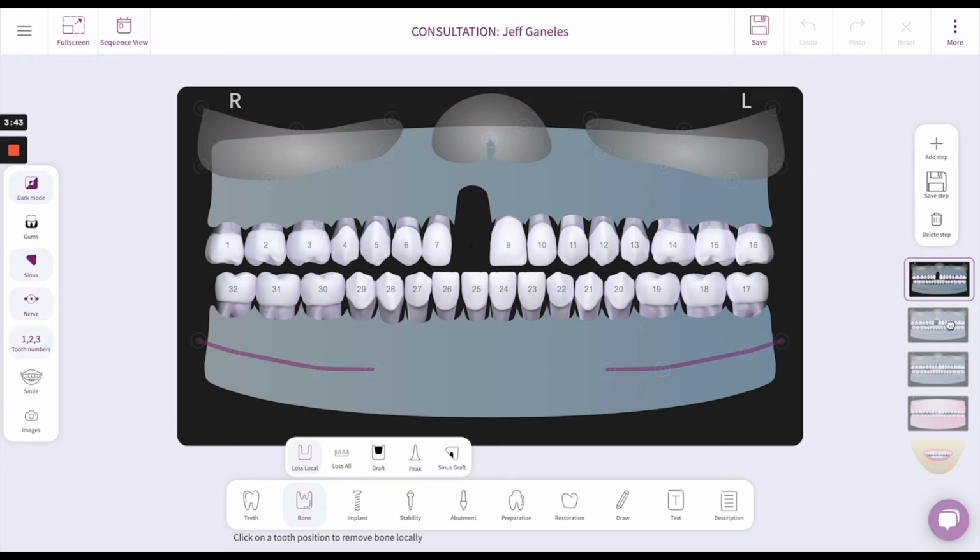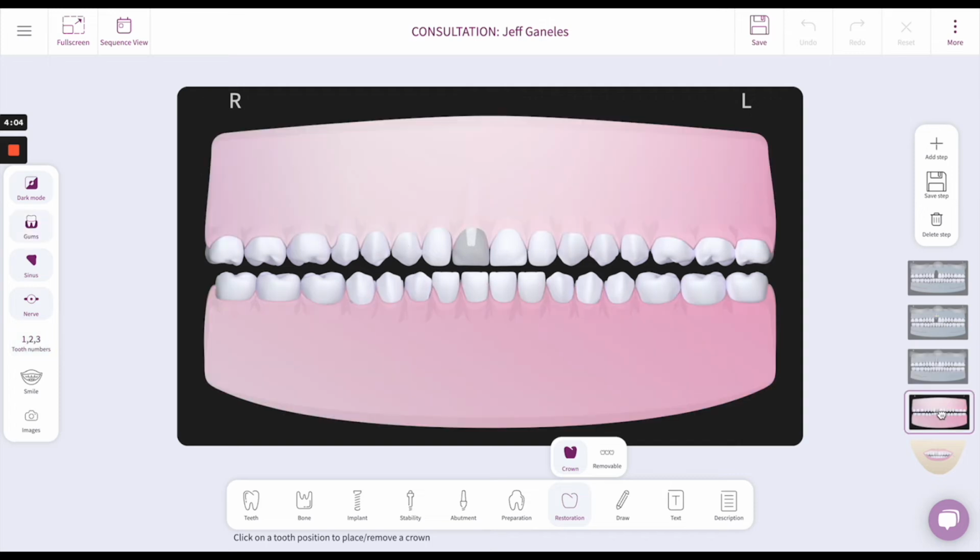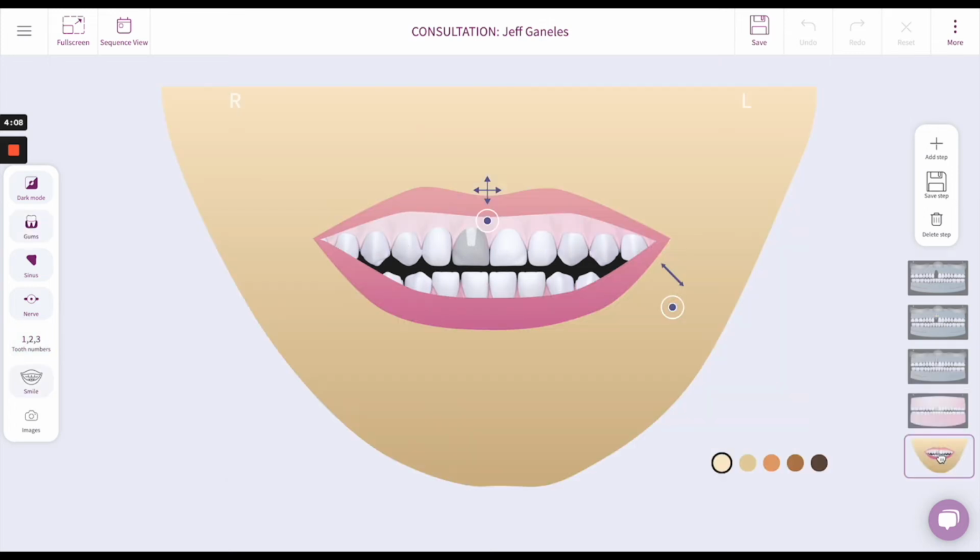And instead of just placing an implant, we now do an implant and some sort of augmentation procedure. So the implant is at the correct vertical position. It's hard to simulate buccal lingual position with this because we're only dealing in 2 dimensions. But now the crown on the implant resembles the adjacent tooth. And at the final restoration, we now have symmetry, which creates all the difference in the world with this patient with a high smile line.